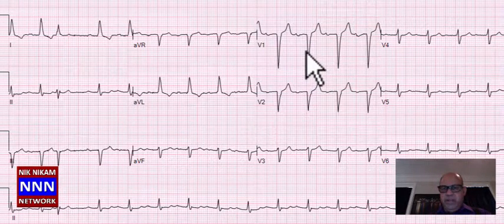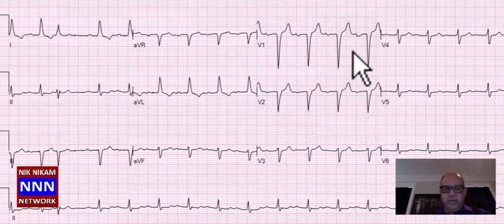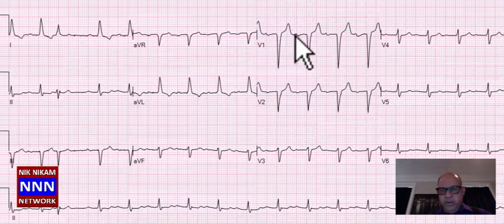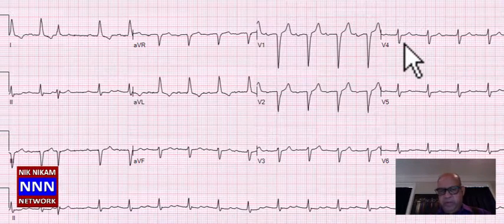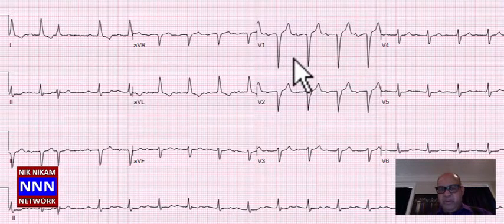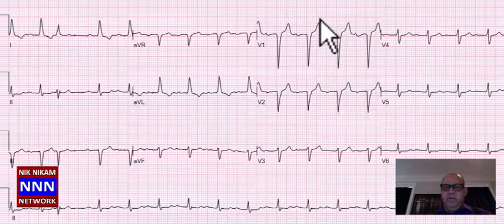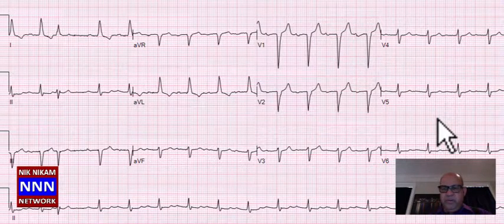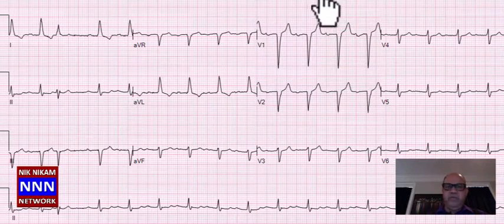So sinus rhythm with, or you can even wonder if this is Wenckebach, but you need a long strip to find out, because short, long, and longer PR interval, and maybe a drop of a QRS complex. Unless you have a rhythm strip, you cannot be certain as to what is happening. But nonetheless, first degree AV block, possible old anteroseptal myocardial infarction, non-specific STT changes. So there are a lot of abnormal findings in this electrocardiogram.